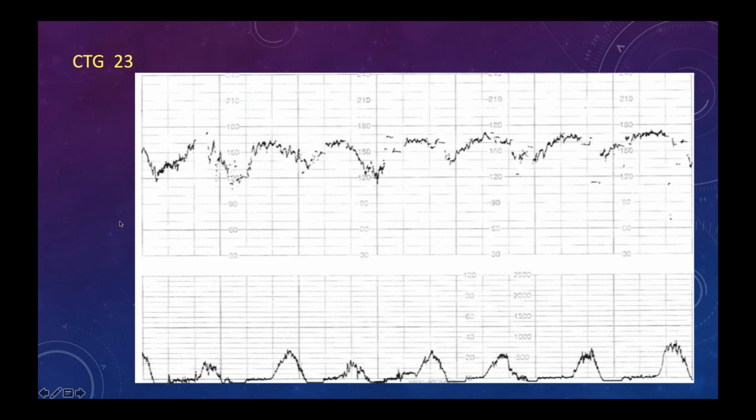No, they are almost with every contraction. More than 50% of contractions. One question, please. How do you count the percentage of the deceleration with contractions? It comes with every contraction. It means 100%, isn't it? More than 50%. Yeah, more than 50% is there. Even just looking at the trace, you'll be able to see it is more than 50% of contractions. So what is the feature?